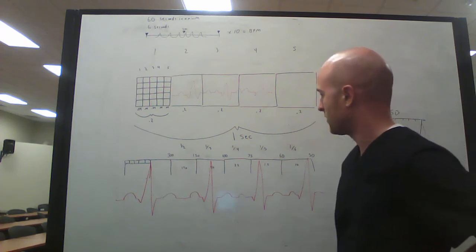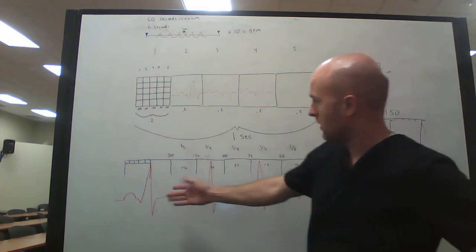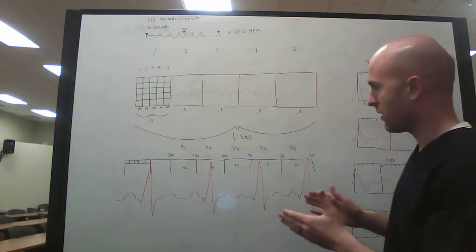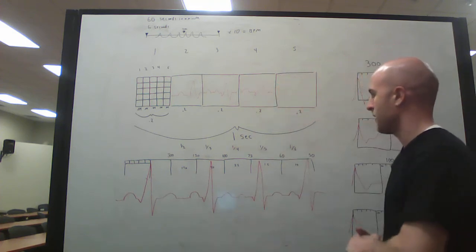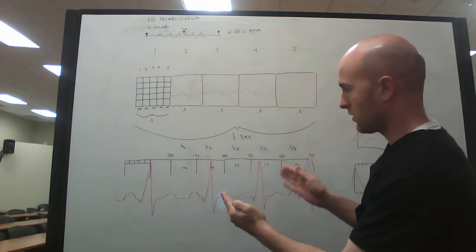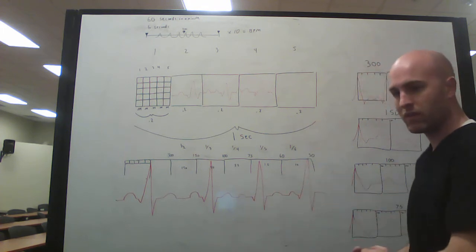What you do is look at this piece of EKG paper, and you see that there are these big R waves at the top here in the QRS complex. You're going to count the number of big boxes between each QRS wave. However many boxes you go over before you hit the next QRS wave is going to be basically how many beats this person is going to have per minute. It's a way of calculating it.